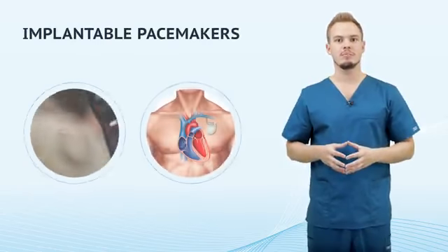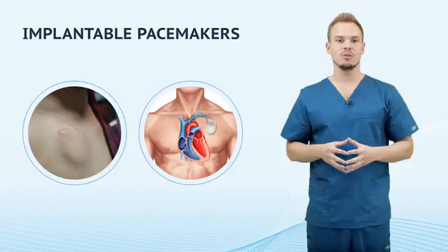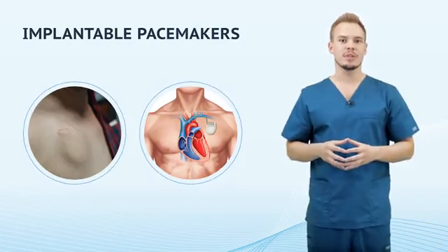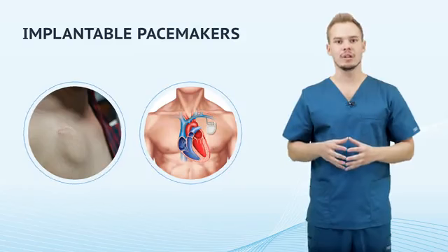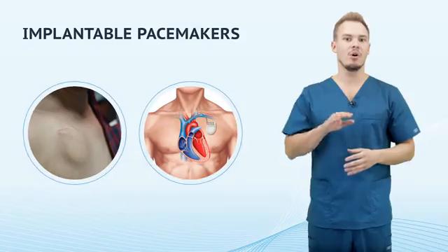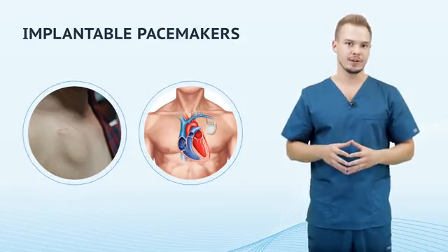Some victims may have implantable pacemakers. They are usually visible under the skin, under the collarbone. Sometimes they are located under the right clavicle instead of the left. Make sure that the AED electrodes are not placed on or near the pacemaker.